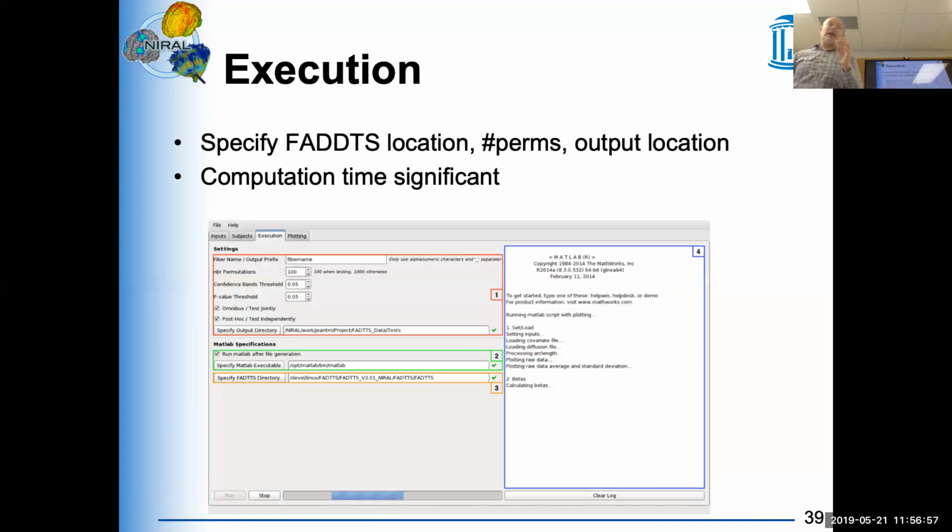This analysis methodology uses permutations to test whether there's significance. The lower the number of permutations you choose, the quicker it is, but also the less accurate. By default, it has 100. That 100 is too little. It says here, use 100 when testing, just to see whether things are working. Use the first one with 100. It's working well. Okay, so now you're good.